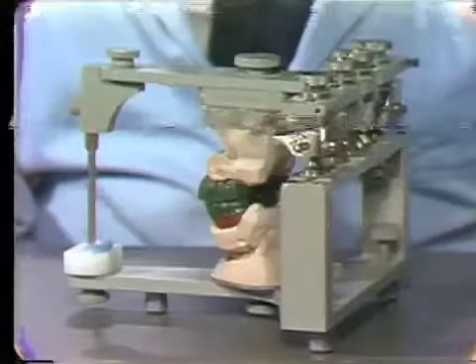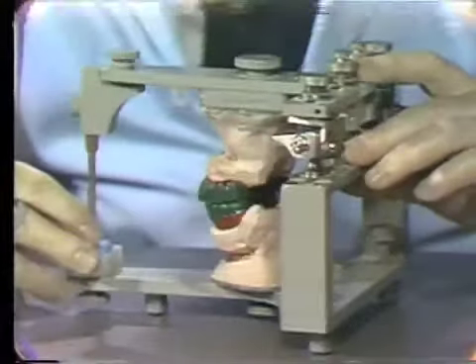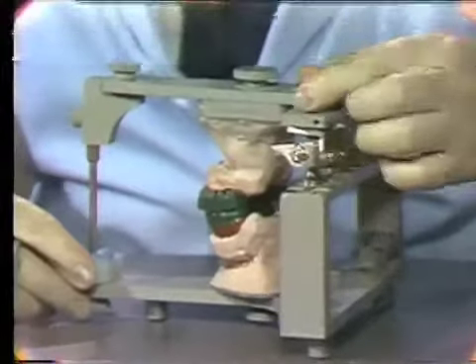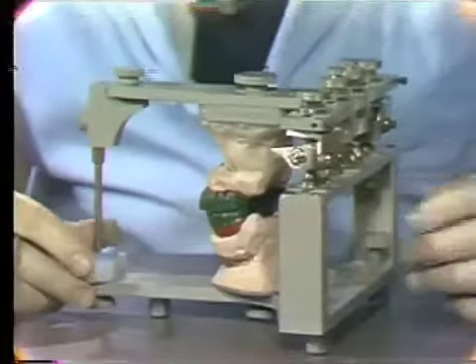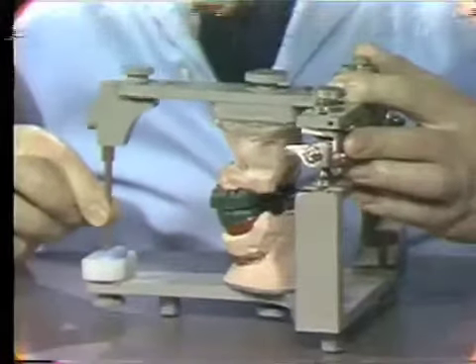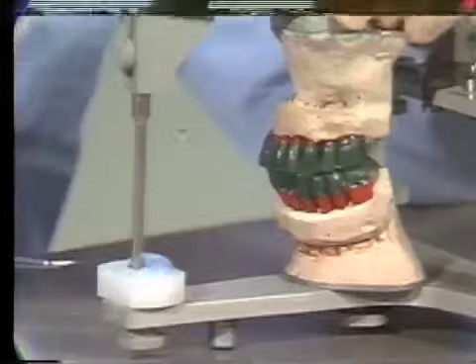When the case returns from the lab with our wax-up of the anterior and posterior teeth, you'll always check to make sure that the articulator, all the adjustments are tight. Make sure all the settings are the same as you recorded before you sent it to lab. Sometimes the setting can come loose and you'll have an erroneous setting. You also want to make sure that the vertical dimension is maintained. Check to see that the incisal pin is down on the incisal table.